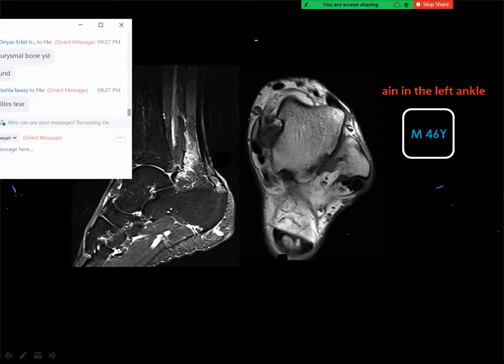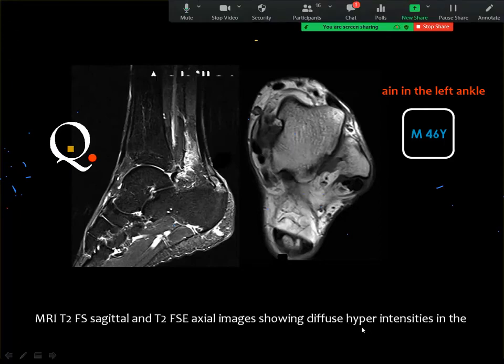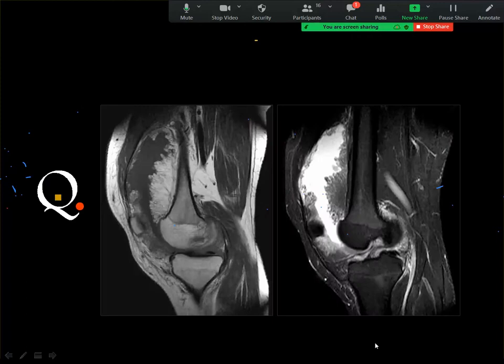And this is not torn Achilles tendon. If you look carefully in the axial images, you can see some abnormalities inside the substance of the tendon, which is almost intact. Then if you got abnormal signal, yes, this is tendinosis, I agree. And this is Achilles tendinosis. You diagnose Achilles tendonitis or tendinosis by abnormal signal and sometimes increased caliber of the tendon, but the tendon remains intact.